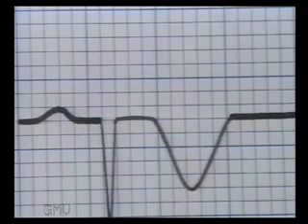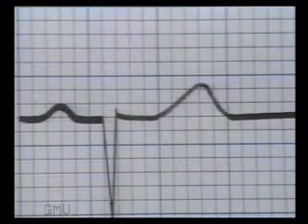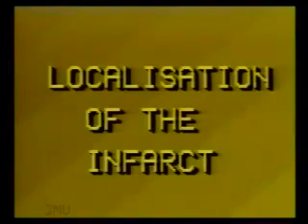Now a QS complex is formed with deeply inverted T wave during second and third week. And this is the picture after 3 months where the T wave has become upright and only a deep QS complex persists.